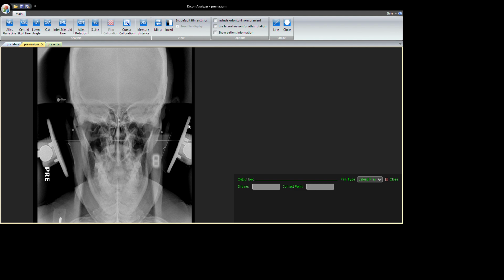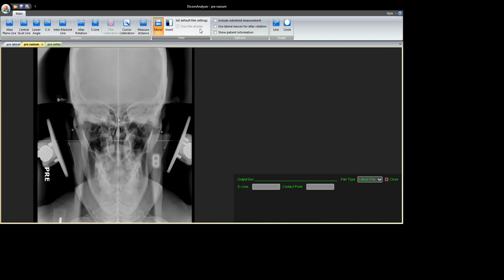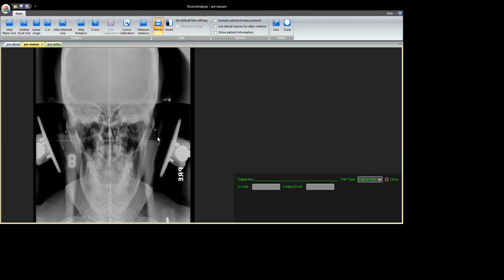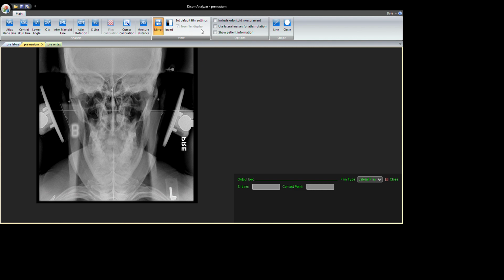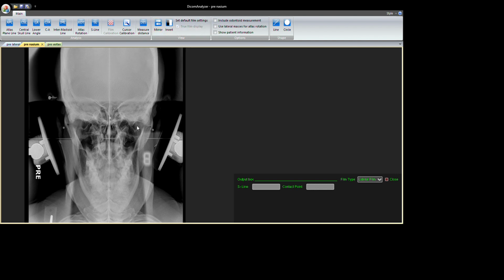So when you get this image on here and you start flipping it back and forth, this one's not exactly centered to the center of the image, but you're looking for whether the head is turning or rotating as you're doing that. And then just make sure that when you're finished that you still have it marked appropriately. This will be lit up in yellow when you have flipped it. So if you don't have a marker, you've forgotten it, and you know the image is right, that'll tell you whether you're in a mirrored or not mirrored position.